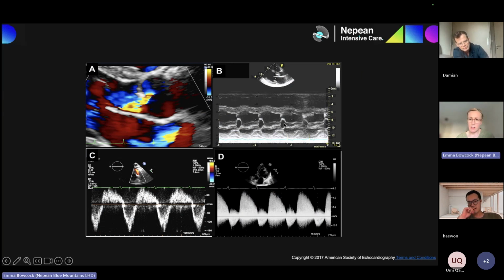So we've got premature closure again here. This is all severe. You've got holodiastolic flow reversal. Just to recap, this is someone with a really severe jet, really dense, the same density as what's going forward, super steep pressure half time, premature closure. If you saw all of these, without even seeing any moving pictures, you should be able to pick that this is someone with severe AR.